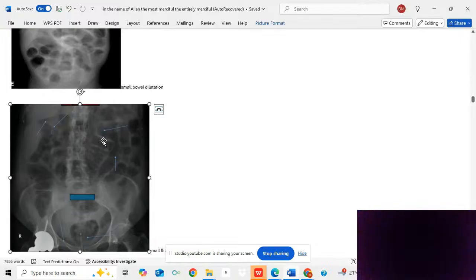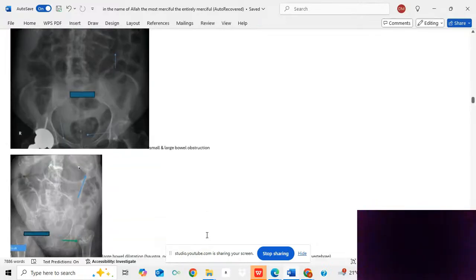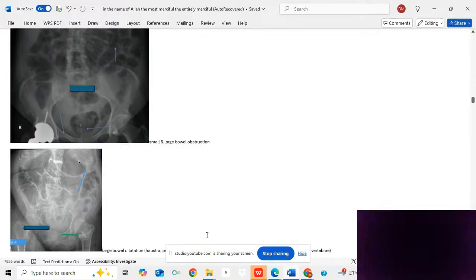I think I have here a case with loss of valvulae conniventes due to a hugely dilated small bowel loop, okay? So here they tend to be centrally located, contain valvulae conniventes, and tend to not spare the lower 2 or 3 lumbar vertebrae while traversing the spine.